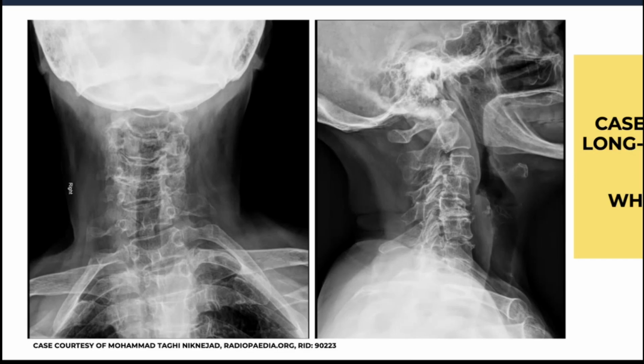Oh, we have a typer. Looks like degenerative changes at the disc vertebral unit. Got Lauren typing as well. Oh, loss of joint space higher up, so maybe OA.